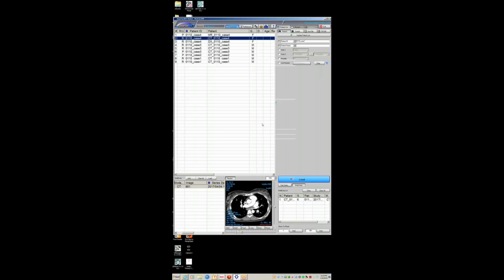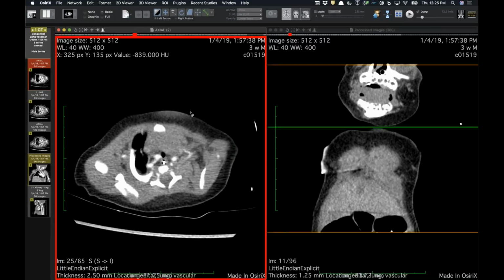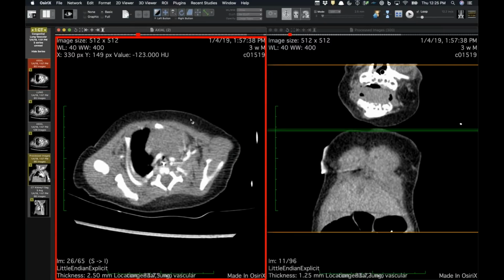I've got a few cases, a lot more cardiac stuff this week. This is an interesting one that just came into our congenital conference this week, and it's as much about nomenclature as anything else. So this is a 3-week-old. This was done elsewhere, and the patient was referred in because they were trying to figure out the degree of left lung hypoplasia. That was the specific question, and also his left pulmonary artery branching pattern.